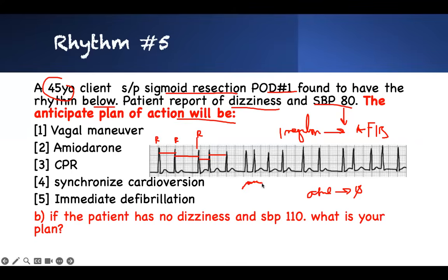It's different from ventricular fibrillation. So the atrium is fibrillating. It's like shaking, like it's acting out. The blood is there, it's just rotating, not doing anything, right? It's a fast rhythm, right? And you have to calculate, and you can see from here, there's only one distance. So I can assume the heart rate is greater than 150. But you have to get the full 60 seconds, and then you can calculate, right? But look at it. This is what we have: an irregular rhythm, a fast one, and I have symptoms.